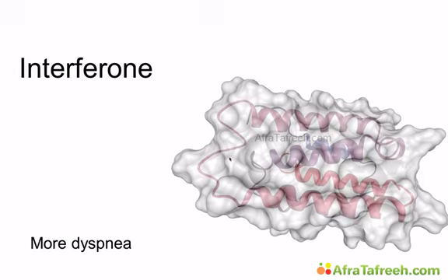Another question we got from Alan, how is the strain? Well, I would like to know. At this time we did not have the system available to measure the strain, and then we tried to do that retrospectively. The only problem was he had so much shadowing from this apical region that we were not able to perform strain. But it would be a very interesting question, because I would actually assume that the patient has subclinical left ventricular dysfunction. Because he has restrictive cardiomyopathy, we see that very frequently in patients where we still have a normal left ventricle.